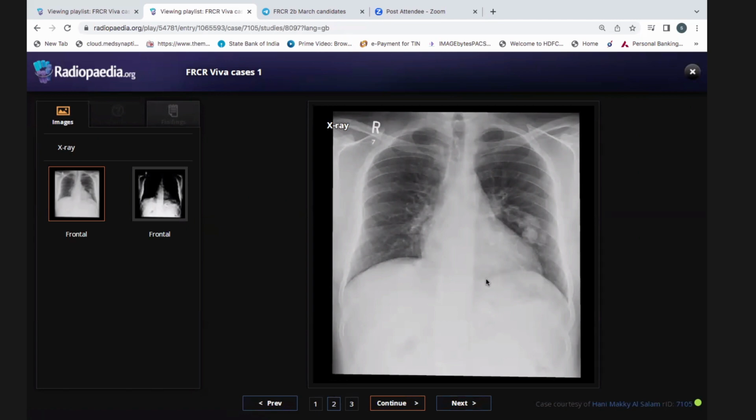This is a middle-aged patient who had presented with a cerebral abscess and was being investigated. Frontal radiograph of chest of a skeletally mature patient. The left mid-lung zone shows lobulated opacities with linear opacity extending to the hilum.